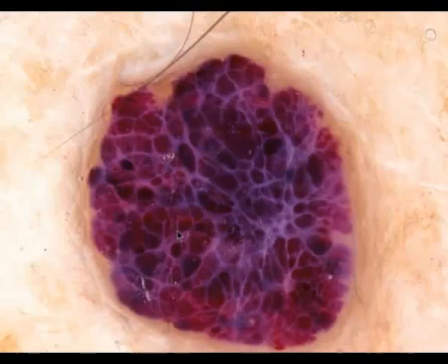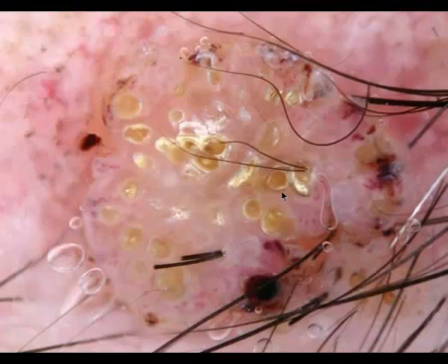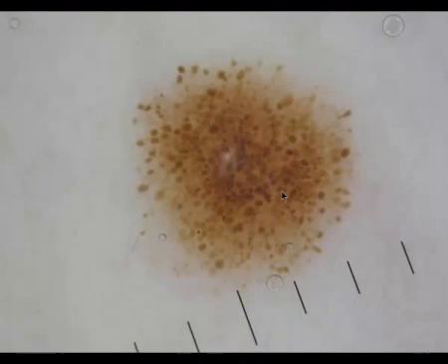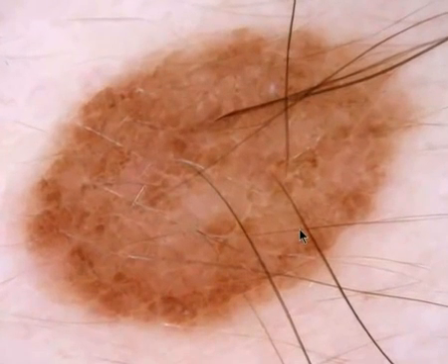Now let's see some examples. A pattern of clods, and the clods are red, so the diagnosis is angioma, hemangioma, correct. Now which type of clods? There are white clods and yellow clods, some of them orange. This means seborrheic keratosis. Here you have yellow clods, seborrheic keratosis. Here you have skin-colored clods, dermal nevus, type Unna. Here you have brown clods. This is just a congenital nevus. Here you have brown clods, again a congenital nevus.